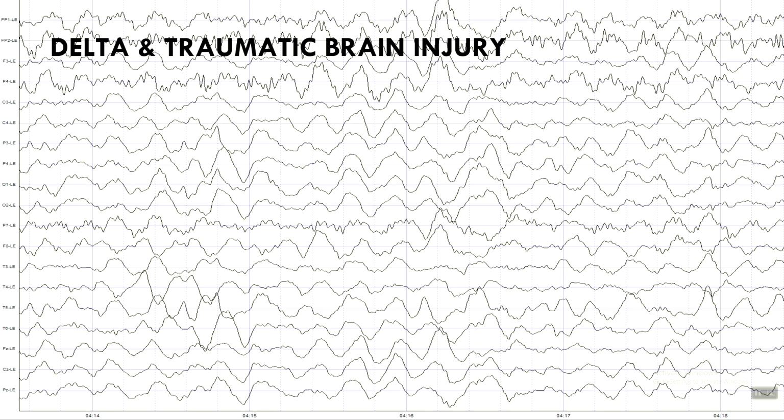Basically what you'd want to do is imagine the repeating rhythm, right? Sometimes it's not continuous. There are moments where, for instance, it fades out a bit at the end over here. But you can see that we have approximately a 3 to 4 hertz rhythm running through the EEG. Does that make sense? Okay.